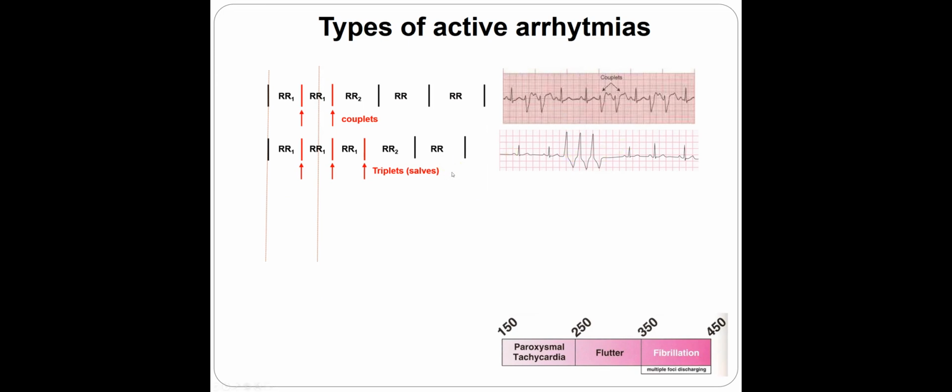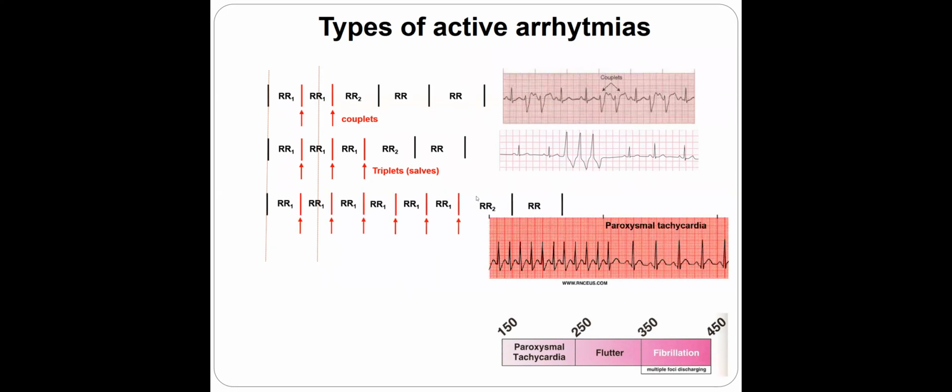If we have more, this is rhythm. So for example here, if we do have more than 3 beats as early coming beats, that's called suddenly started tachycardia, because it's active, so it speeds up the heart. That's called paroxysmal tachycardia. What is the meaning of paroxysmal tachycardia? Start suddenly and ending suddenly. Usually a paroxysmal tachycardia is started with a premature beat and ended with another premature beat.